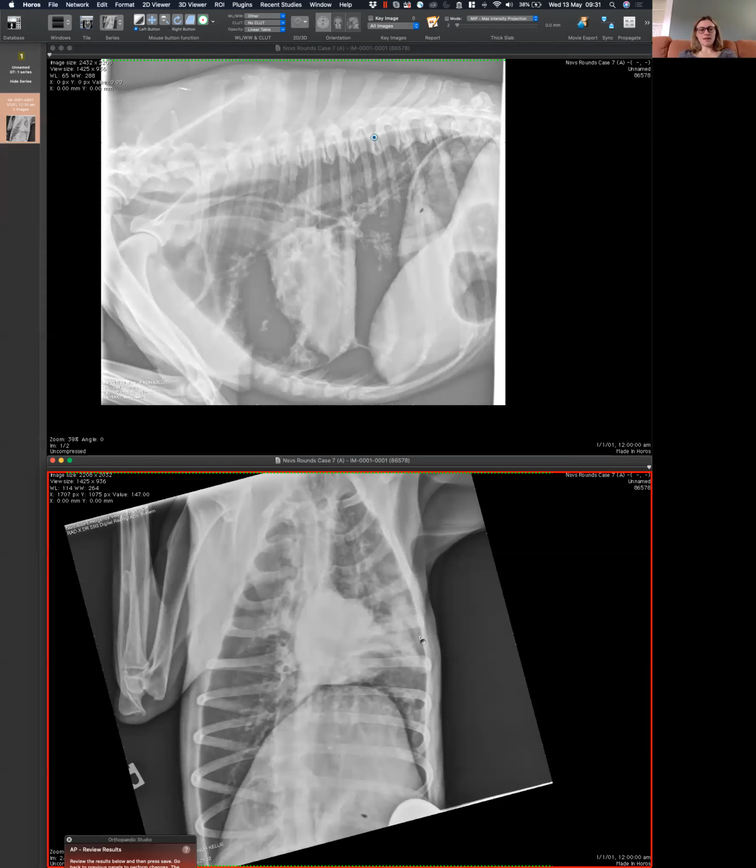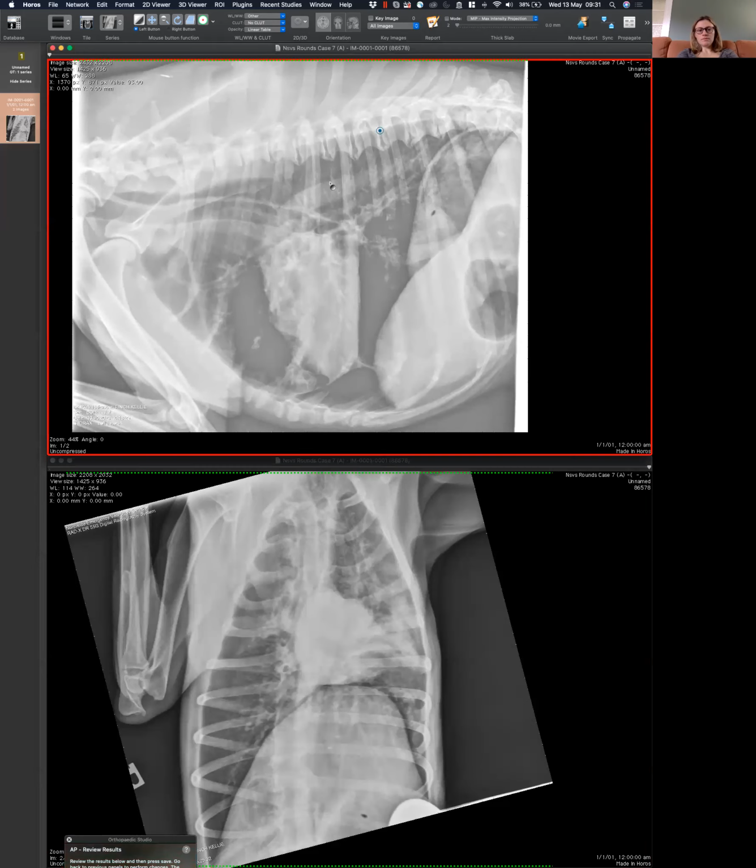Mariana, can we discuss whether there's a megaesophagus here? Okay, cool, because that was the other comment. And actually that comes together with something about seeing too many structures, and I thought there was some kind of implication of having a pneumomediastinum.